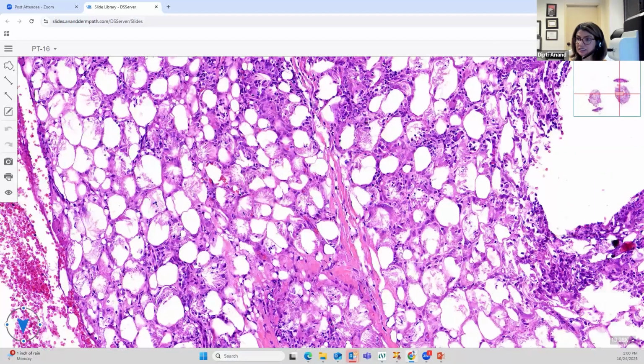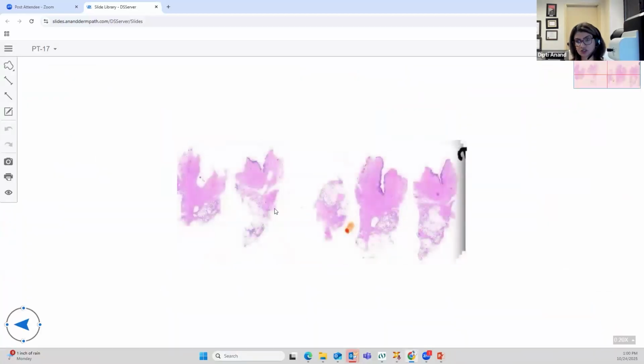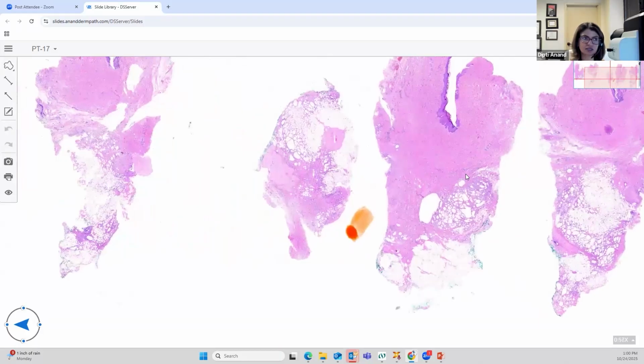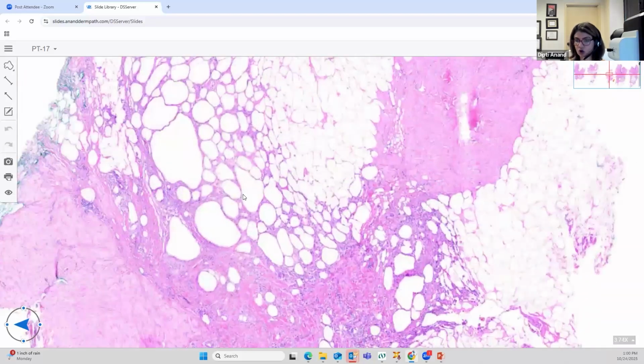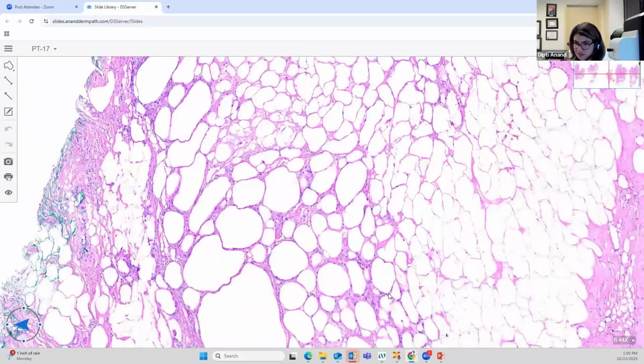Okay. The next panniculitis, which is probably the most complicated of all panniculitis, is a traumatic panniculitis. Because it is iatrogenic, it doesn't obey any rule. Okay, so it will have both a septolobular pattern. So there is septal fibrosis. There is lobular panniculitis, where again you see variably sized fatty spaces.